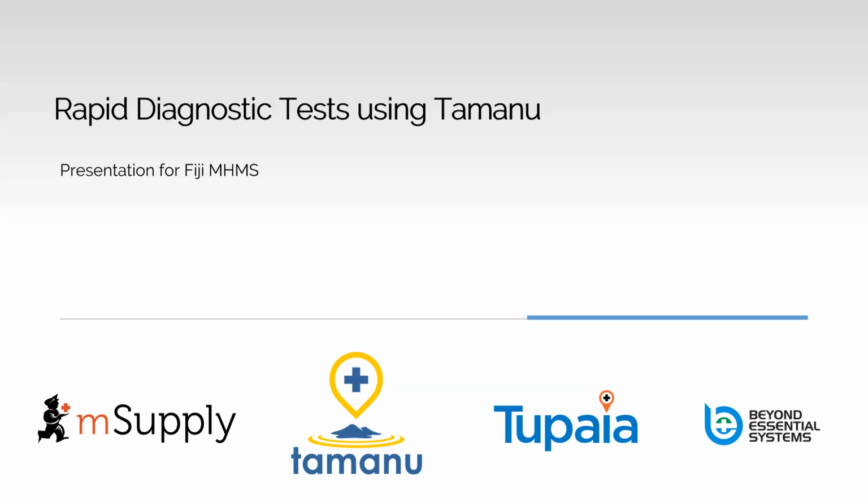Today we're going to be running through rapid diagnostic tests using Tamanu Mobile. This is functionality that has been prepared for the Fiji Ministry of Health and Medical Services, and it's very, very similar to the functionality that we have been implementing for several months in Fiji already.